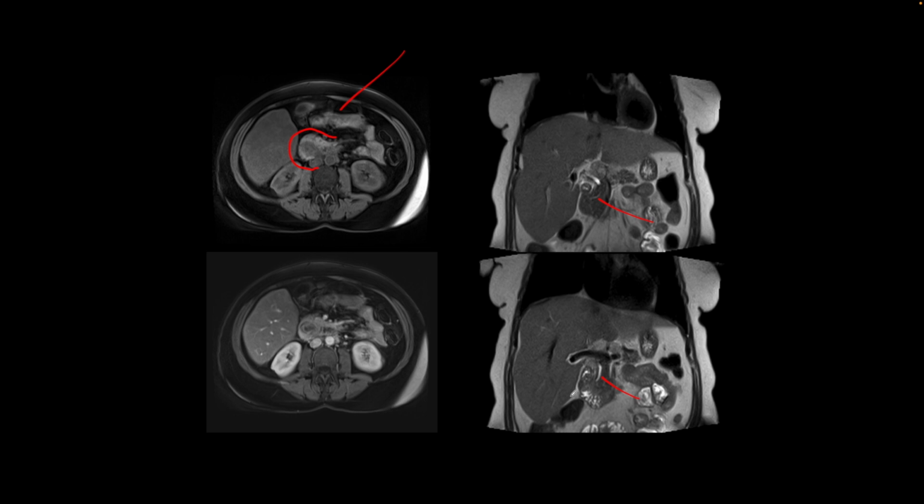So there is a divergence between the pancreatic duct and the CBD as they go to the duodenum, and that's called pancreas divisum. Also on the post-contrast image we find that the pancreatic parenchyma is enhancing all around the loop of bowel, which is the second portion of the duodenum, and so this patient has annular pancreas with pancreas divisum.